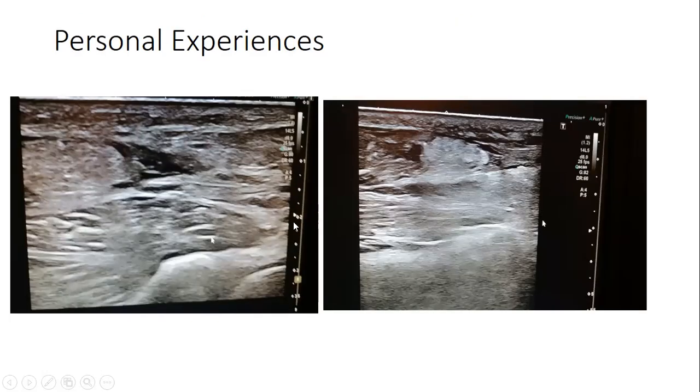Okay, so on our screen, this is the scan that was done on me, but this one was done after, I think on the 2nd week. What we see there is that there was the rupture, but what I suspect we also have here must be a hematoma.